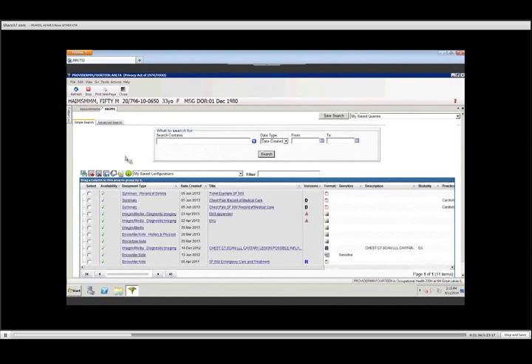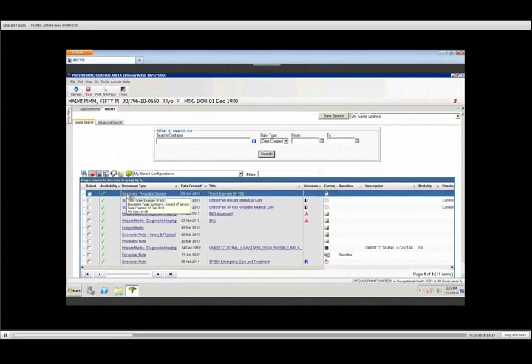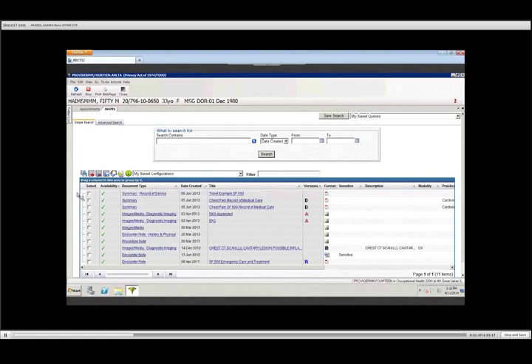Okay, let's talk a little bit more about these icons over on the left. One very unique functionality from within the HAIMS system is what we call hovering to discover. If I take my mouse and hover over icons or hyperlinks, I get pop-up boxes. These boxes will either tell me a little more information about what I'm looking at, or tell me how to perform a certain function.